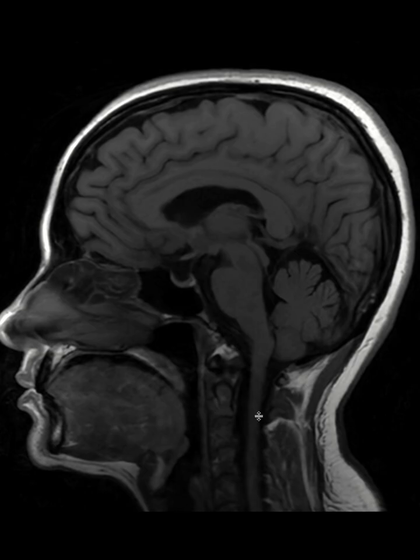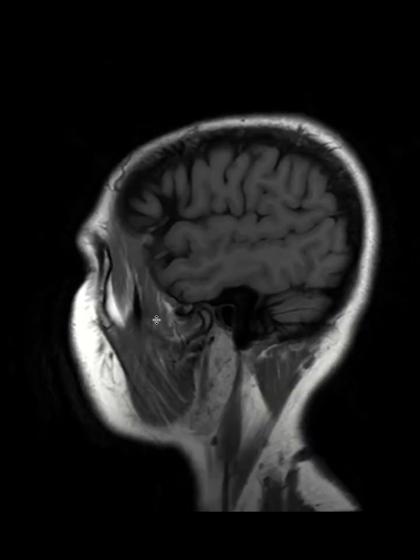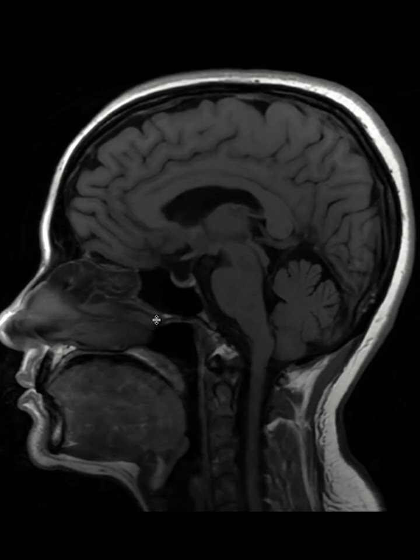This is the regular brain MRI with routine sequences. This is a sagittal T1 sequence. As you see, the fat in the subcutaneous tissues is T1 bright, and that's how I know this is a T1 sequence. The CSF inside, you see, is all dark. That's another sign that this is a T1 sequence. Okay, when I scroll through, I start seeing some lesions. Let's keep going. I'll show you the other side.